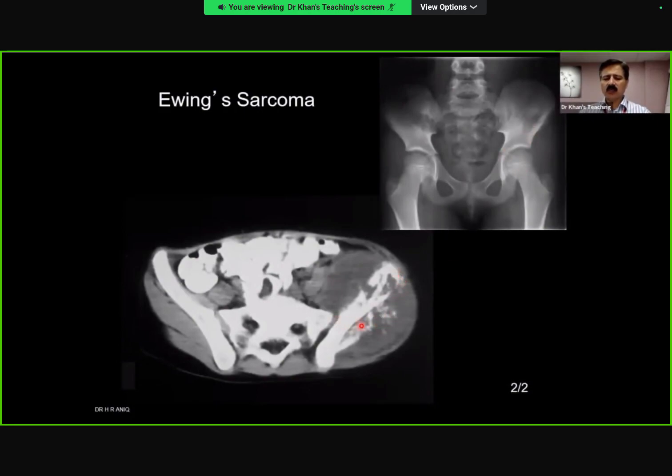Having said that, it's fine. In the exam, it's fine. You've done your duty once you pick it up and ask for an MR, not a CT. But even on this CT, you can see this soft tissue, how thick it is.